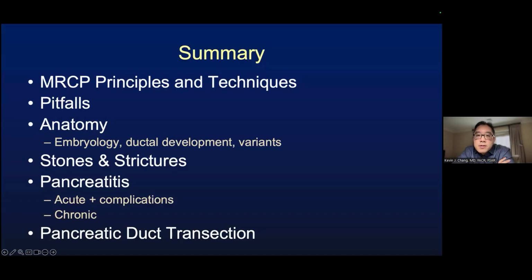And then one last question here is, in the pseudoaneurysm case, how can you differentiate hemorrhagic pancreatitis without contrast? So hemorrhagic pancreatitis on MRI, you can make that diagnosis without contrast on the T1 fat saturated image. We use mDixon. There's a whole bunch of other pulse sequences out there like VIBE and LAVA and whatnot. But basically, you're looking for persistent intrinsic T1 hyperintensity greater than that of the normal pancreatic parenchyma.